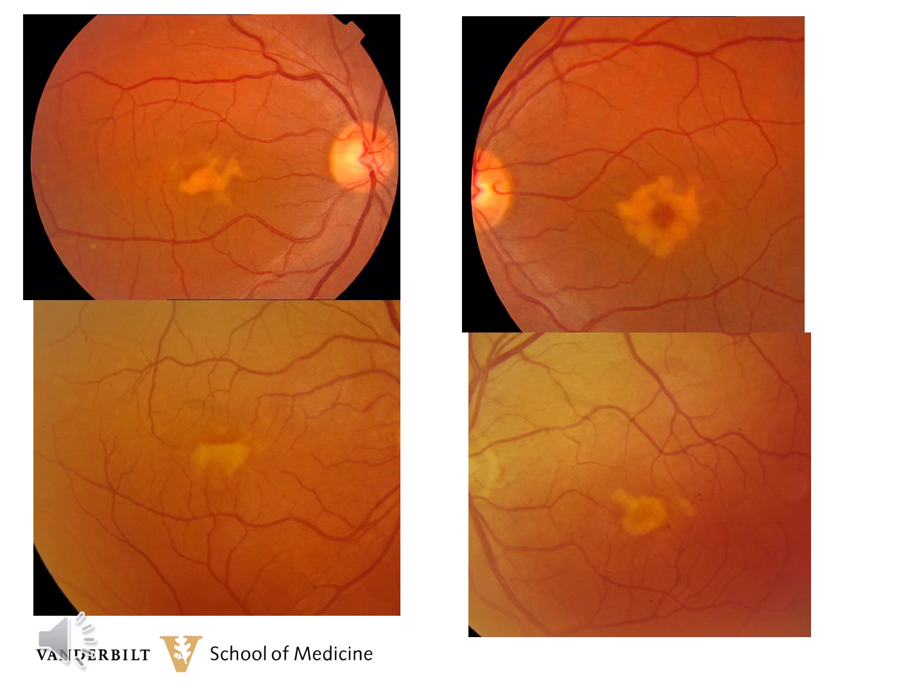The vitelliform lesions do not always have to have a regular circular shape. The two top photographs are of a 40-year-old male with vision of 20/30 in the right eye and 20/25 in the left eye. The bottom two photographs are of a 52-year-old male. He had been told he had macular degeneration 4 years previously. Beware of the diagnosis of macular degeneration in people under the age of 60. Always have your guard up for that.